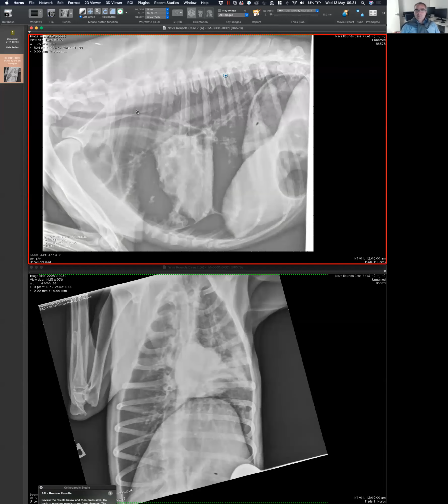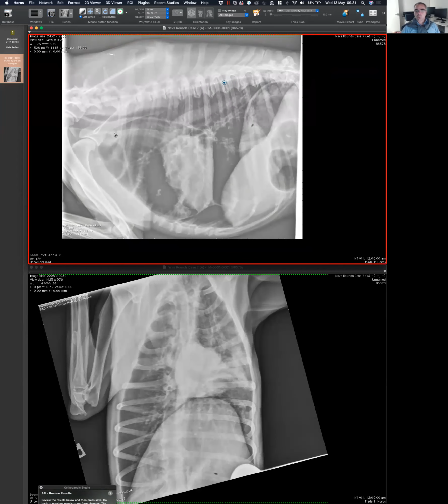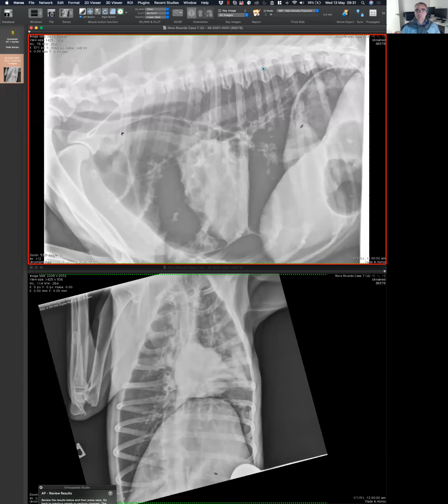So I'll tell you what is abnormal in this case, and what is abnormal is our ability to see that line. We should not be able to see that line, and you should probably not confuse that with the scapula. So I'm going to bring up all the possible confusions. This is the line of the scapula. I've had myself and residents, when this line goes like that, think it's the esophagus. So that's an easy problem. Always make sure that you're not talking about the ventral contour of the scapula. One is there, the other one is there. Okay, so that's not that.